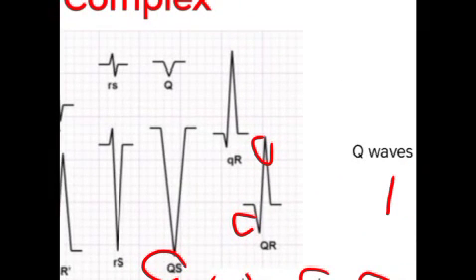This is only when we find a first negative deflection like this here. It is a Q wave, the only negative deflection, the first negative deflection.